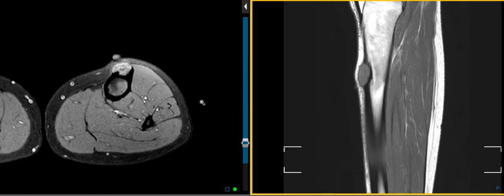We don't have pathology on this, so the diagnosis is uncertain, but just looking at this, we see the margins are very well defined. It's definitely associated with the bony cortex, not the medullary cavity. It's an expansile lesion, and it's not coming right out of the middle of the cortex or back. It's coming along the anterior aspect, like the surface or periosteum. So this may be a periosteal lesion or just a really superficial cortical lesion.